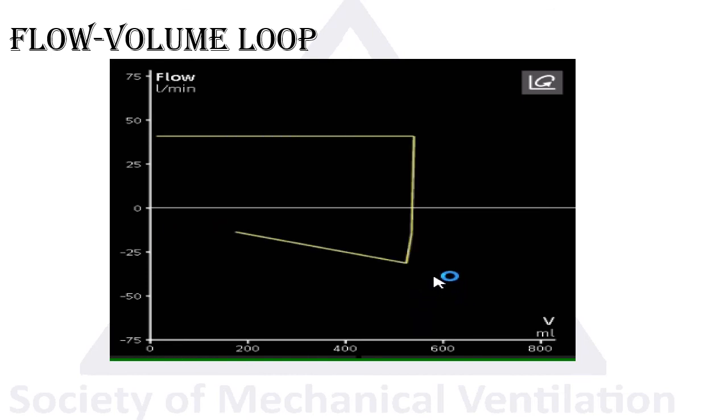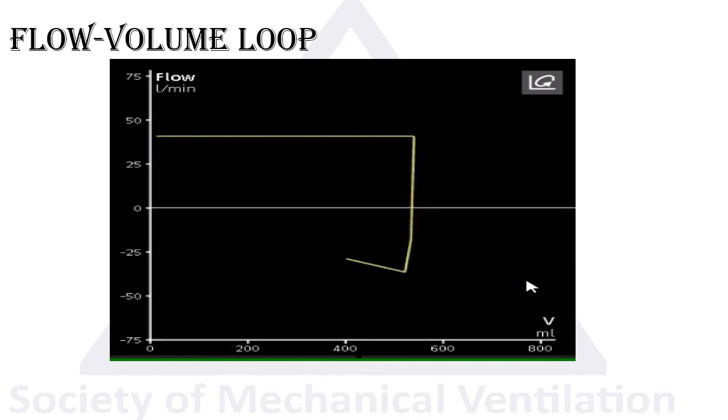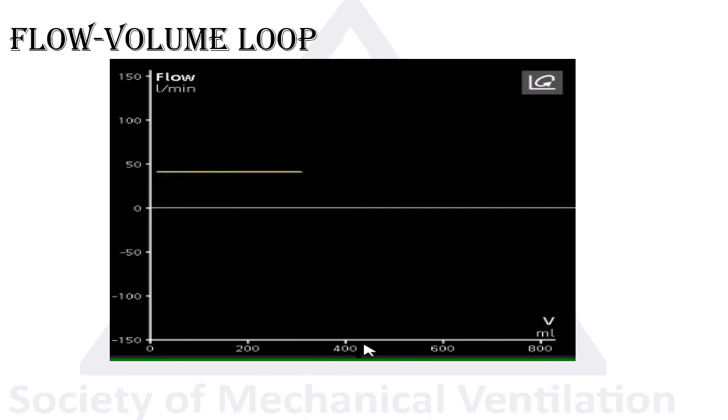Here, start noticing the expiratory flow will start going down. Here the slope is becoming faster. Expiratory flow is reaching down, as you can see.